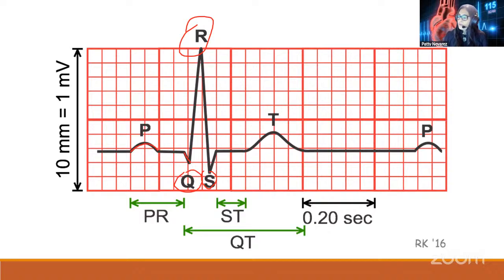And then moving a little bit forward, we are going to see another wave. This one is not so U, but more like a mountain, and that's going to be called the T wave. This one represents the repolarization of the ventricle. As you remember, in the action potential, the cells need to rest and get ready for the next conduction. Now, we can see here QRS is depolarization of the ventricle, T is a repolarization of the ventricle.